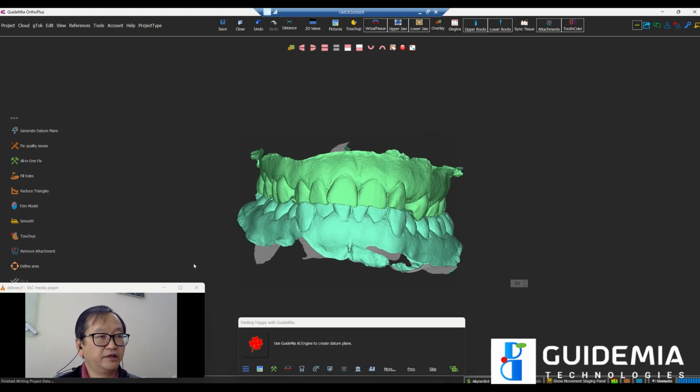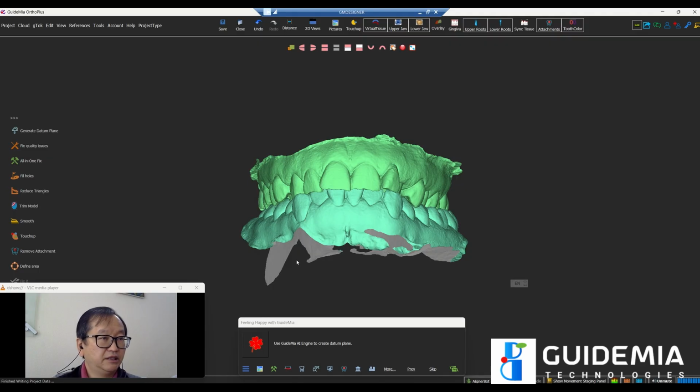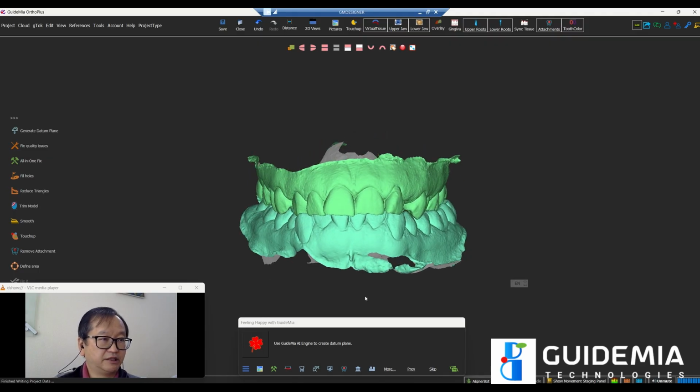But before we get into actual segmentation, let's see how step by step the system will work. We have a so-called Aligner Bot lucky button here, or we call it happy button. You can press this one by one to finish a workflow. In every single step of this workflow, we have additional tools here. That means according to the context, you can do additional things.